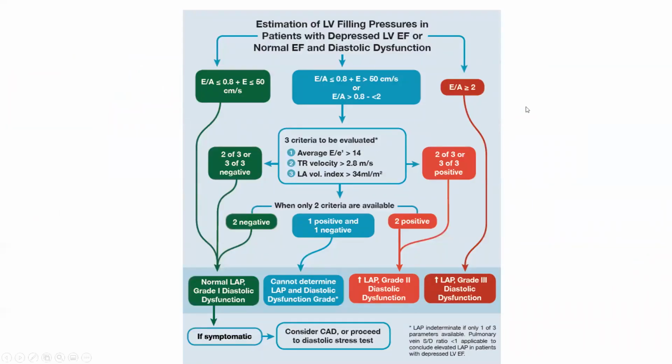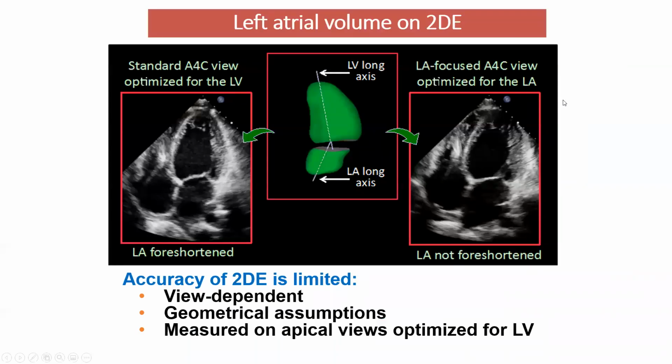As I hinted, left atrial dimension is an important part of diastolic function guidelines. You will have a terrific lecture on this, so I won't get into this. I do want to point out something that, again, Dr. Lang and others using three-dimensional echocardiography have brought to our attention. And this is a little bit off the topic also. I doubt that you'll be tested for this.